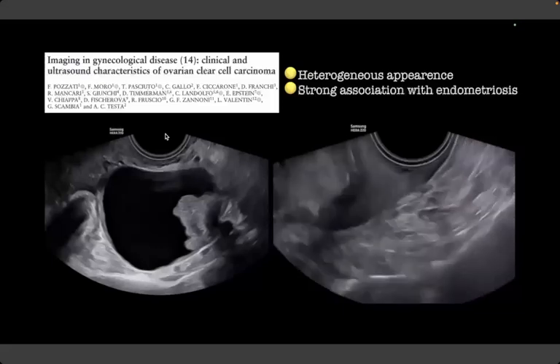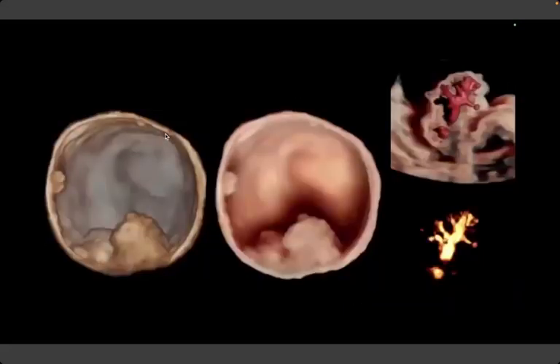Thanks to VSI and realistic crystal view 3D rendering, it is possible to emphasize the appearance of the papillae, and with MV-Flow 3D rendering, the hierarchical vascularization with branches.